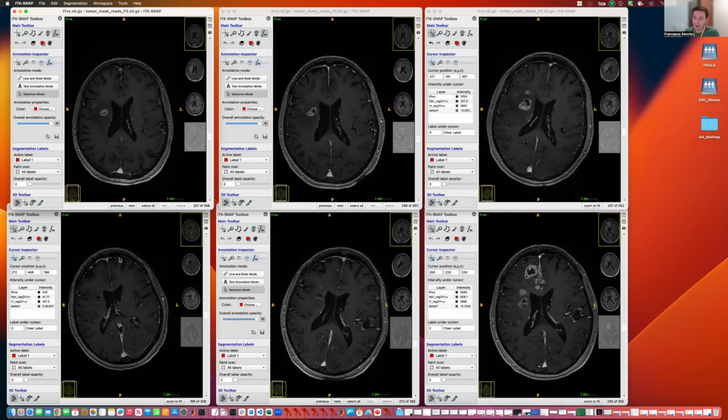But what happens here, as we saw before, is that the lesion shrinks back. So this is what we call PSP or pseudoprogression, which counts as stable disease essentially. And then the lesion is non-measurable and again non-measurable. So this means that the lesion is smaller than the baseline, as we saw from the graphs too. And this is what we can define as a RANO response, PR, partial response.